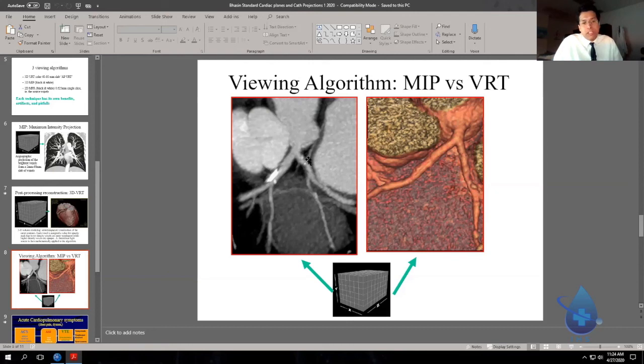Most of the time, the sinus nodal branch takes off from the RCA, 80% of the time, but 20% of the time, it'll take off from the circ, go posterior between the aortic root and the LA, go off to the SVC RA junction.